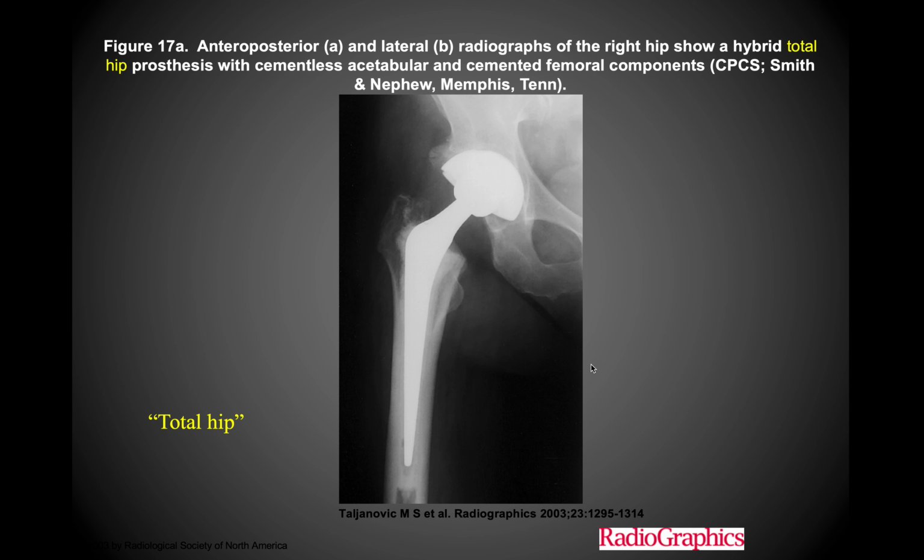And so one of the major ways that we treat osteoarthritis of the hip is total hip replacement. So we just call this a total hip, or a total hip arthroplasty. And so effectively the way that we do this is, you can see this is called the acetabular cup right here, which is placed within the acetabulum, and then there's a ball that sits within that cup that allows for the hip to be able to pivot in virtually any angle.